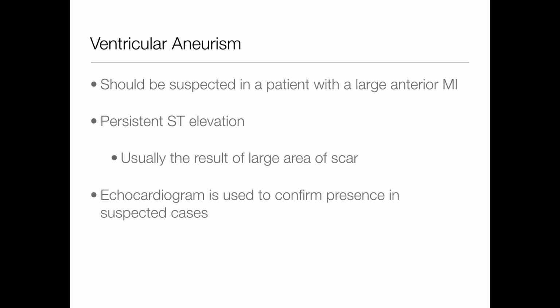And what it will cause is persistent ST elevation that sticks around maybe weeks after the MI has taken care of itself, and they've been to the cath lab and the angioplasty is done, but the ST segment elevation is still there. What we would do in these patients is we'd look at an echocardiogram to see if in fact that's what's going on, and if they needed it, maybe they would be sent to surgery. So ventricular aneurysm, something to keep in mind with persistent ST elevation.